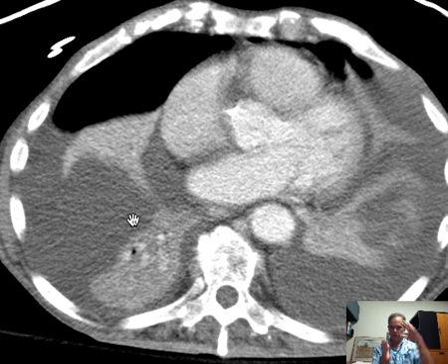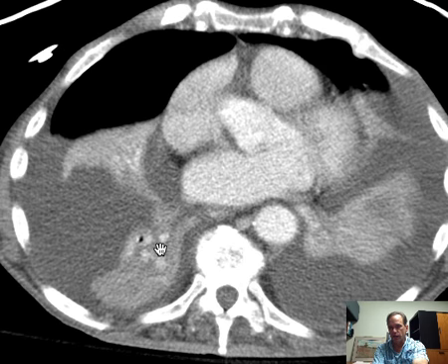When the lung, let's say we have a lung like this, has fluid collecting around the base, it squeezes against that base much more so than the upper lobes very often, and that causes this compression of the involved adjacent portions of the lung that are associated with the pleural fluid. It squeezes them down, and just as a basic simple mechanical pressure, that forces the air out and causes atelectasis.